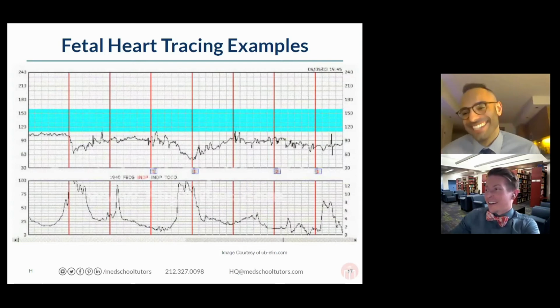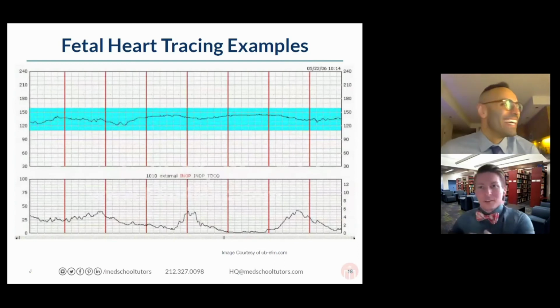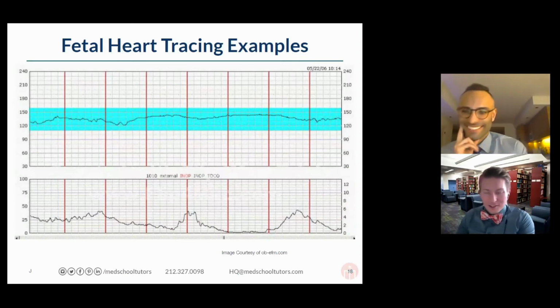Yeah. All right. Well, I'm going to make things harder here. I'm going to bring up our next image here, and I'm going to ask, what do students see with this one? So no training wheels on this one. Just type into chat what you think is happening with this tracing, with the contractions that we're seeing here. How would you diagnose this one?